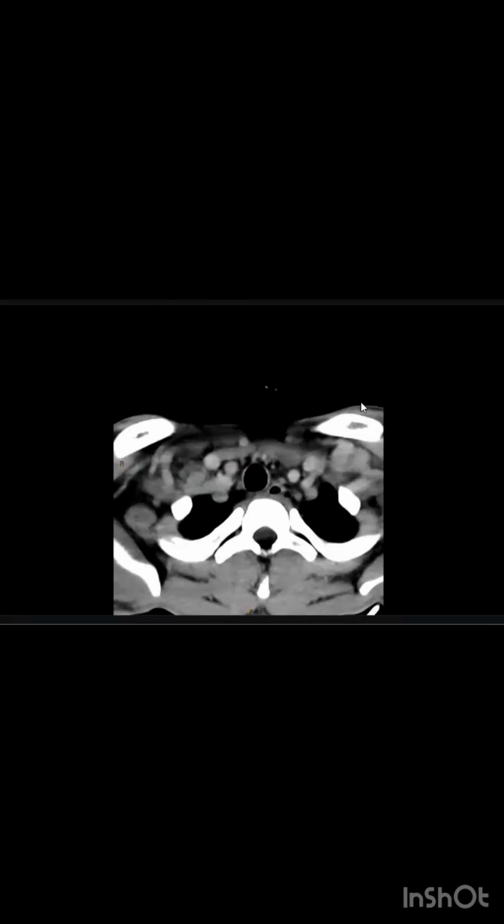I can appreciate that in the region of the anterior triangle of the neck, multiple lymph nodes are noted. Along the left side, there are air foci. Multiple lymph nodes are noted extending along the vessels as well as the posterior triangle of the right side. There is also lymphadenopathy. The thyroid gland is normally visualized. There is no evidence of air foci within the strap muscles and the neck soft tissues. However, adherent to the sternocleidomastoid, there is smudging of the fat and hazy, blurry soft tissue planes.